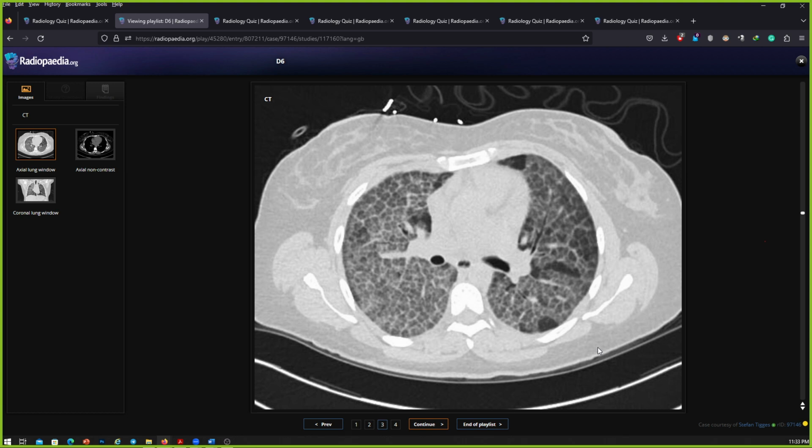Pulmonary alveolar proteinosis. So good. Okay, so what will be your management in this case? I accept your primary diagnosis and I accept your differentials. Okay, I will refer this. I will convey my findings to the referring physician and ask them to immediately refer this patient to the pulmonologist and do the required blood tests for this patient. And if possible, bronchoalveolar lavage can be considered if they don't find any other cause.